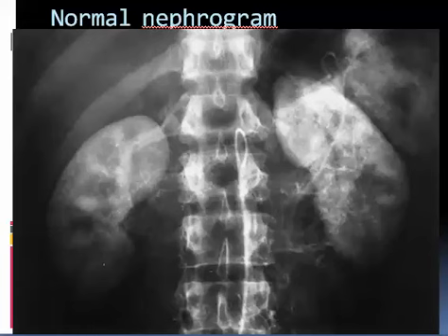After a while, if this is 20 seconds, after 45 or up to 70 seconds, the whole thing will be opacified, casting the shape of the kidney due to contrast filling into glomeruli and into the loops of Henle and the renal collecting tubules, because glomeruli are located along the cortex only, or mainly.